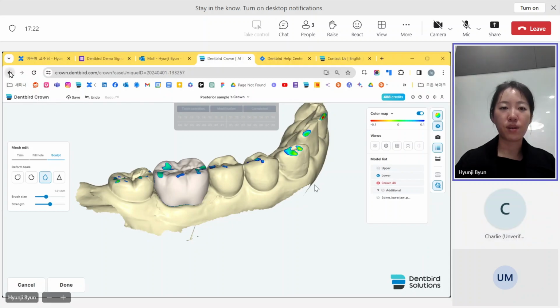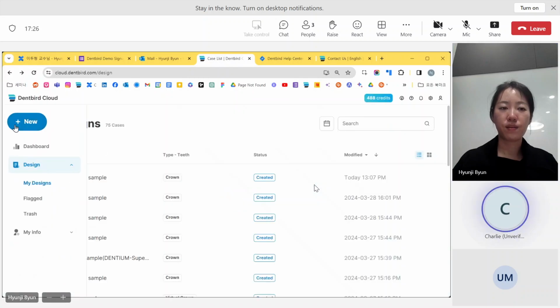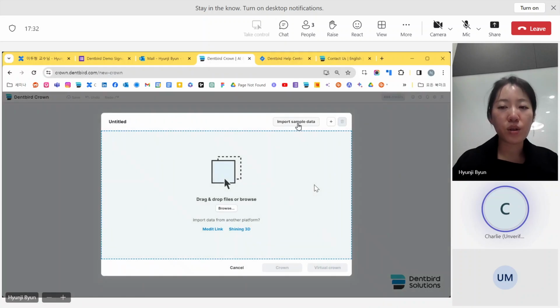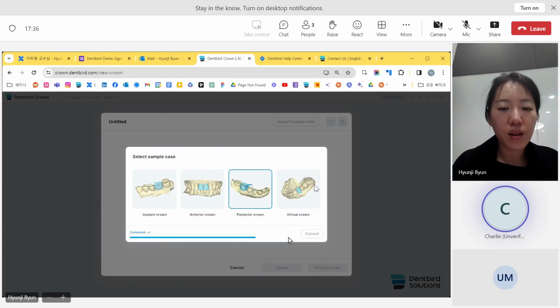Sure, let me go back to the... Because I think in the 3D print zirconia, there's a tool for color ratio, right? And there's a different tool for function. I mean for zirconia, because right now we just want to try to print with the 3D printer. So I think we want to know more about how to use it with the 3D printer.